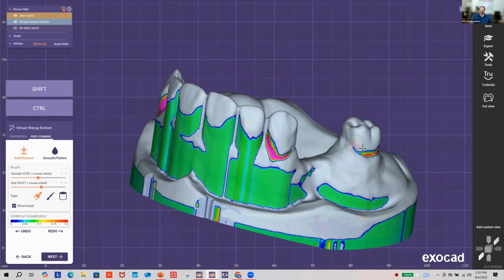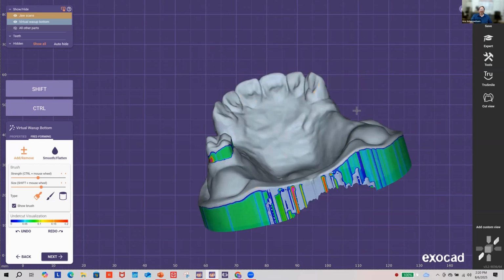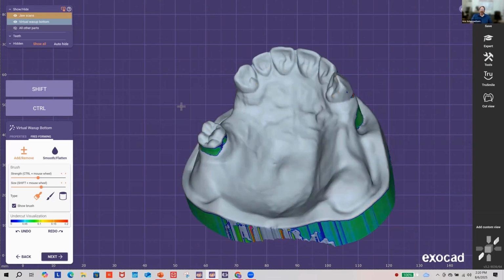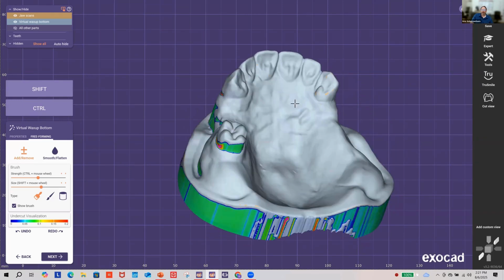This is where your finisher will love you if it's not you, and you'll love yourself. Because these partials usually will drop, just a few touches here and there. Once you really get a little experience, I would recommend, if you have the ability to, if you're designing or if you have a designer, have them design and then have them fit those bases down, or work with the finisher to fit those down. And I'll tell you what, that person doing those designs will really dial in their undercuts quickly, whenever they have to fit those down into place.